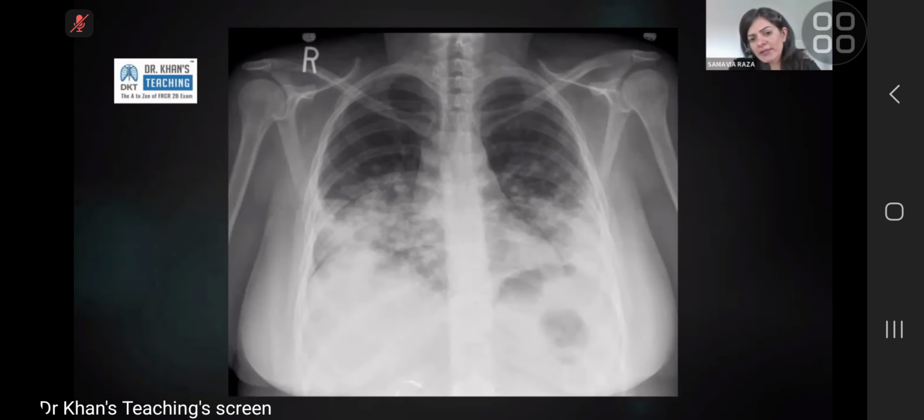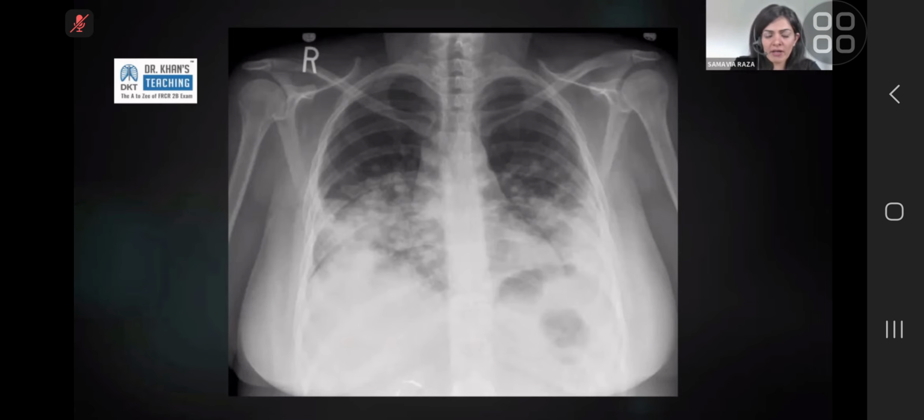And when you want to call somebody as pulmonary edema, if you're saying cardiogenic pulmonary edema, you want pleural effusions, you want cardiomegaly, you want perihilar opacification. You see none of that on this chest X-ray. So heart failure would be pretty low down on my differential.